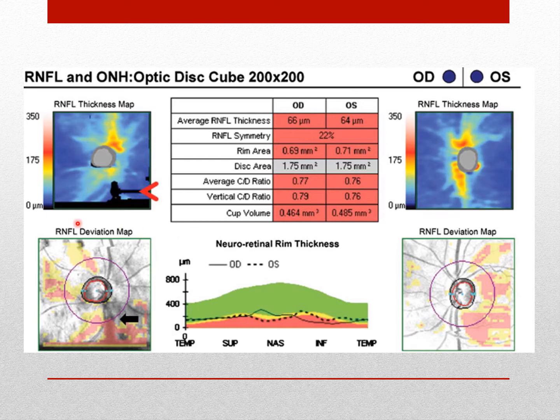And you know that's not true. There's always going to be some cells in each layer. It's not going to be like a clean slate. So this is just because of the vitreous opacity that it couldn't detect the structures of the retina and the nerve. So that's why it's having like shaded areas.